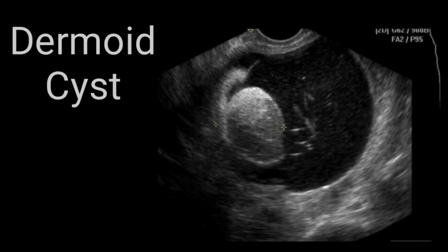If you give it as a differential, that there is a likely possibility of dermoid cyst, then you can advise a follow-up scan after 4 to 6 weeks. And if the size and the contents remain the same and there is no regression, and there is sometimes enlargement in the dermoid cyst, then you can follow the same procedure. Advise the MRI scan, advise the patient to consult the gynae department.